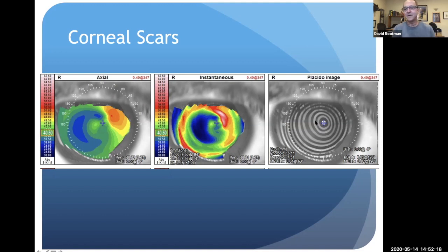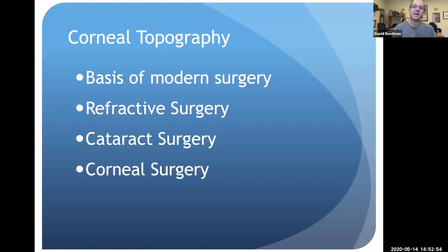And it's telling. Not only do we see that it's very flat in this zone, that's due to tissue loss. But look, it's a little bit hazy as well, though this isn't the best way to diagnose haze. But this patient actually had a pseudomonas ulcer and has quite a bit of irregular astigmatism and induced astigmatism as a result of the loss of tissue. And this may give us the information to, or give us the gumption to proceed with a topo-guided procedure to try and correct their vision rather than jumping straight in with a DALK or a PKP.